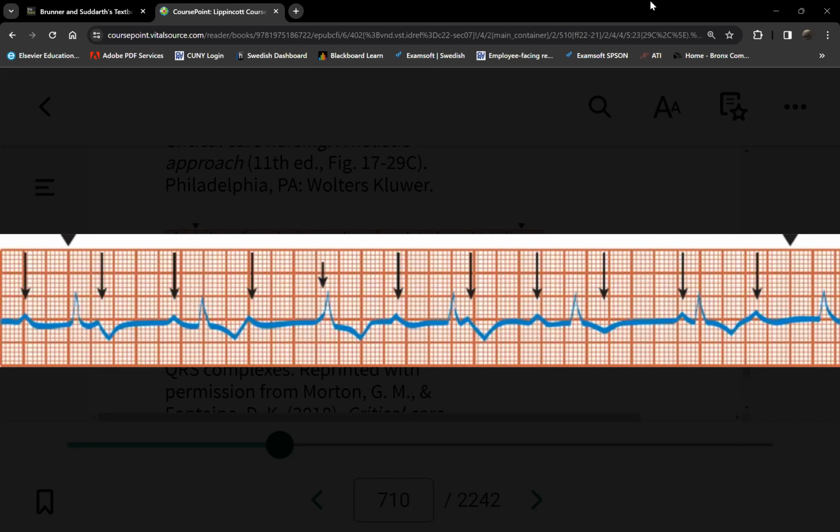So as you can see, are the P waves occurring regularly? The P to P, is that regular? Same interval, right? This is an exception, but P of that P to that P, is that regular? Yes. Same distance as the first two. Again, same, right? So therefore, since they're P waves, is the SA node firing? Yes, it is. And last week, we learned that the AV node, is that a pacemaker also? Yes, it's a secondary, right?